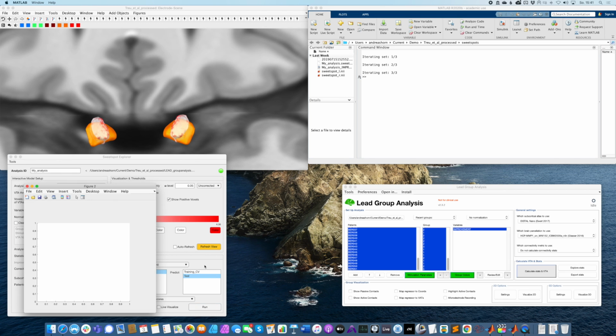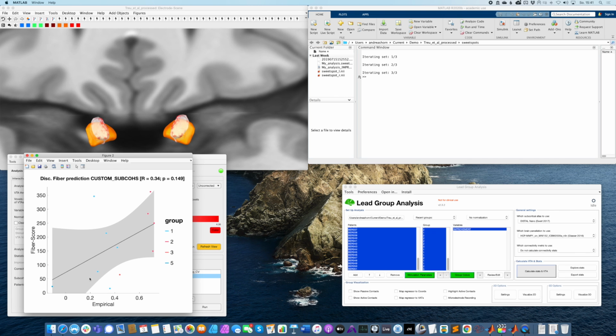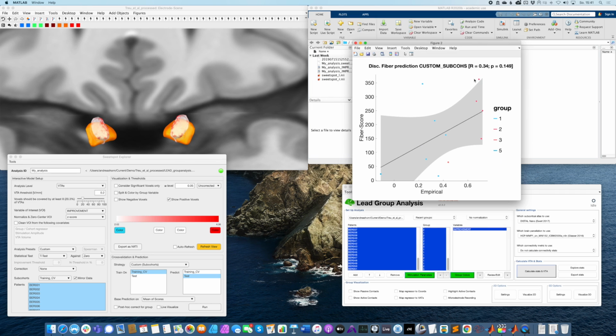So again, okay, we have a nice prediction, but it's not significant. In our case, the reason is that the test set I chose while doing this video was quite small, right? We have an N of only around 10 patients, so we would need a very high correlation to make that fit.